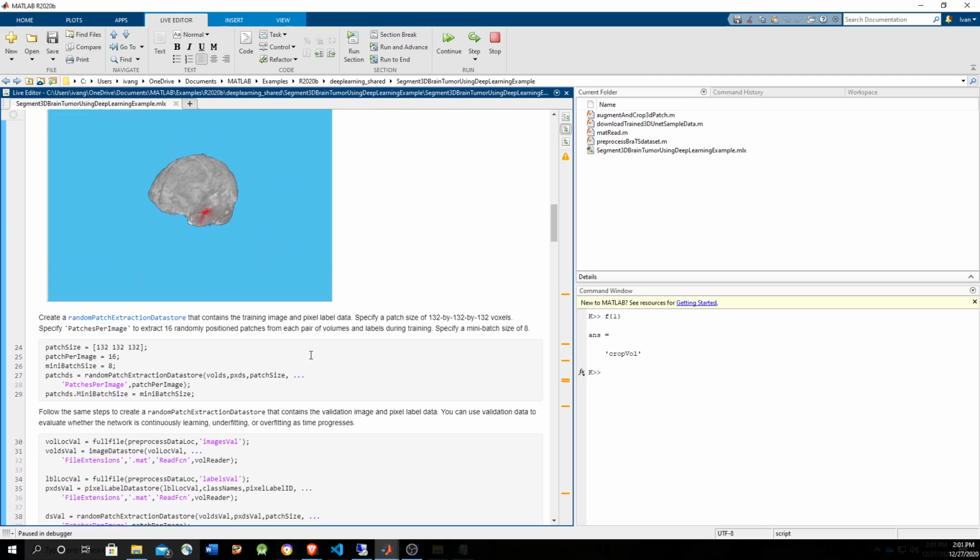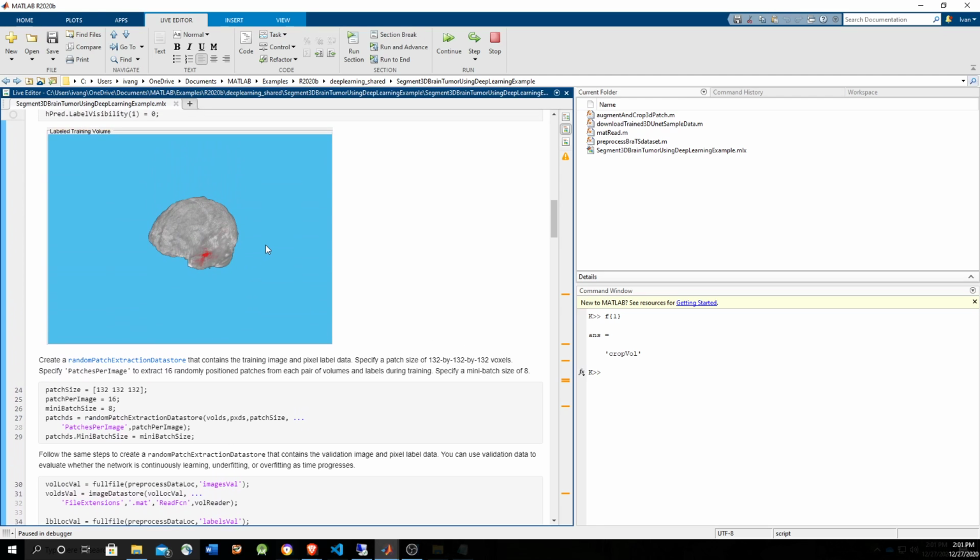Data augmentation is going to apply some affine transforms to the image. Affine transforms mean rotation, translation, shearing, flipping vertically, horizontally, some subset of that or a combination of them. The reason why that is done is to multiply your data even more. For example, let's say this image, you flip it vertically, you flip it horizontally, then you have 3 additional copies, 3 different additional training points for your neural network.